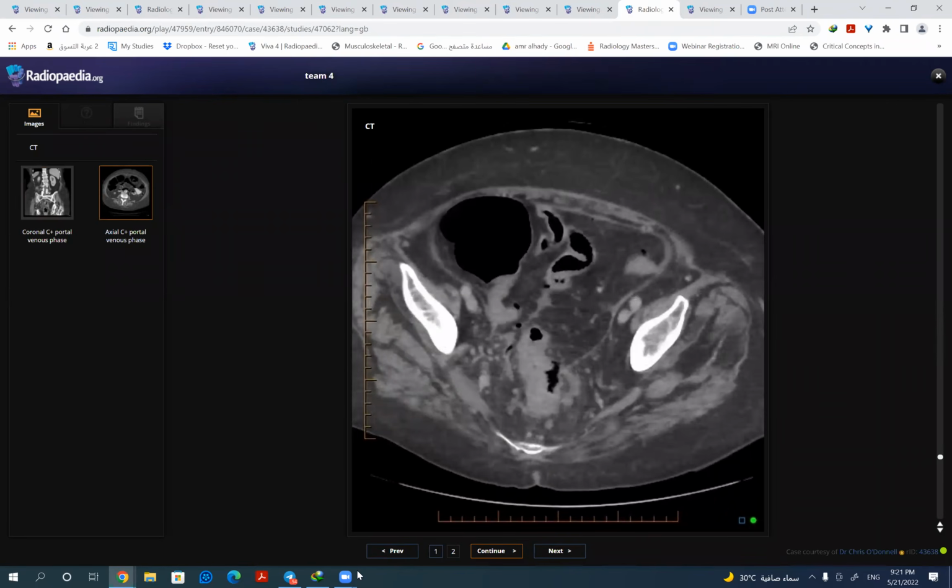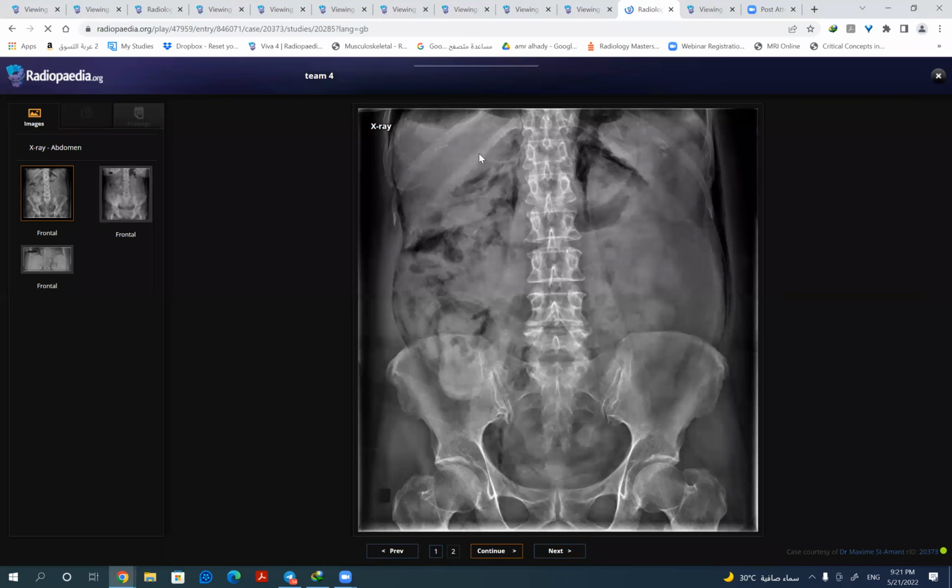Yes, exactly. And this one, yes, post-operative, as you mentioned, you picked up the stoma and the retroperitoneal air nicely, so perfectly done. And also the cause, as I mentioned, post-ERCP: you must mention if there is any history of ERCP, but this is from the stoma here and the others. Yes, it is post-operative pneumoretroperitoneum, exactly.